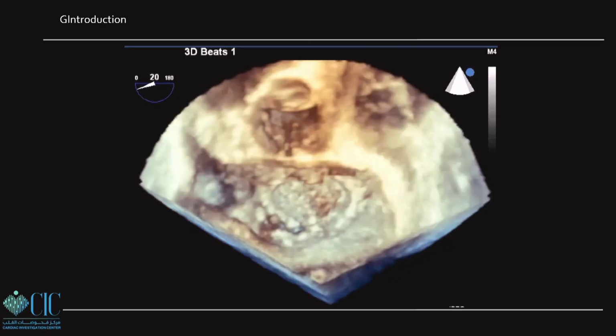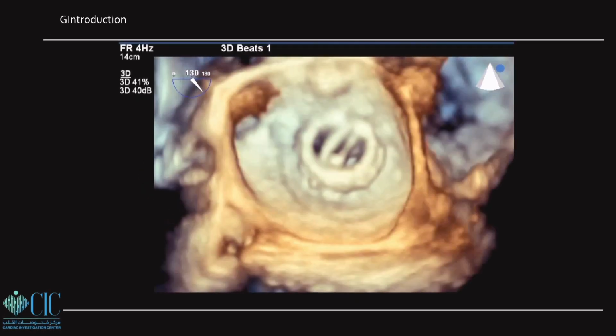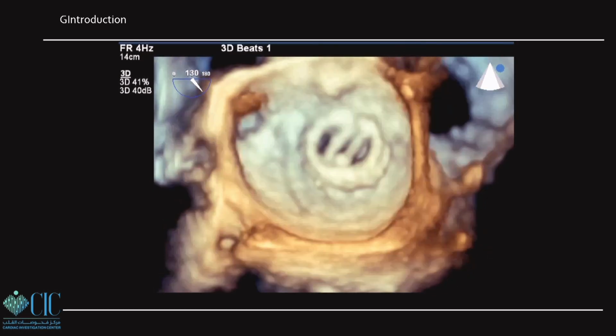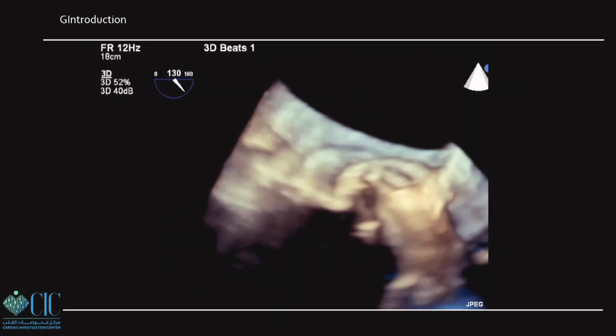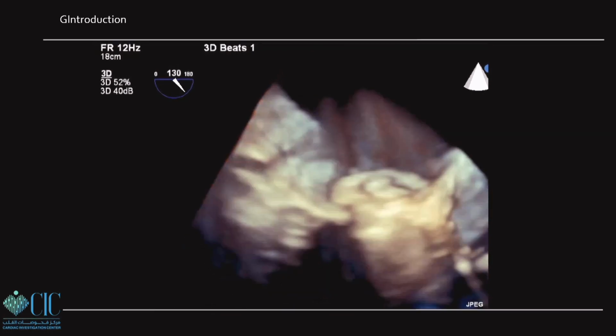That's again a straight defect. If we are in the left atrium, we can see the left ventricle. But look at this defect. I can't see the real defect. The valve is supra-annular a little bit, but there is something here, but I can't see a straight path. It is not like an ASD. I can't see the left ventricle from the left atrium. That's why I need to get this by the narrow sector live 3D. See that? It is bigger than the annulus, actually, and dehisced.